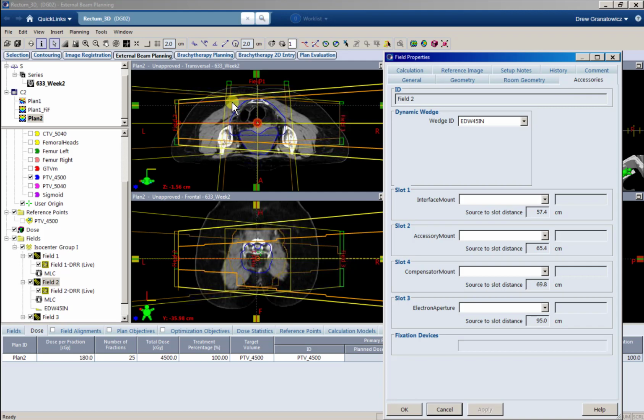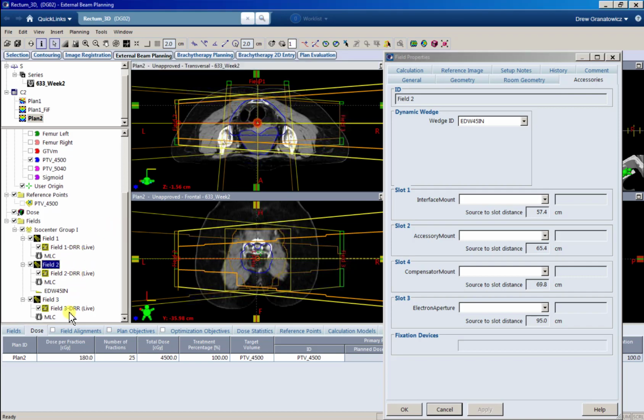So again, I want my heel to be on the posterior side, right? Because I want to push, or, you know, I say push, but understand that I'm not really pushing dose, obviously. I'm just attenuating more dose posteriorly than I am anteriorly, which will even out that dose distribution, right? It'll get rid of some of those hot spots in the back and just kind of even it out, right?